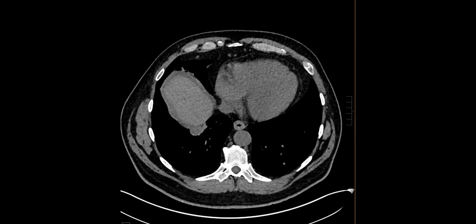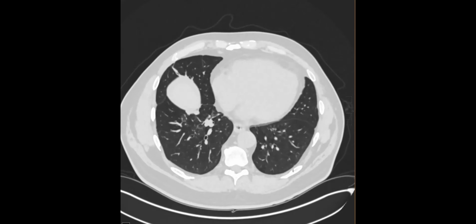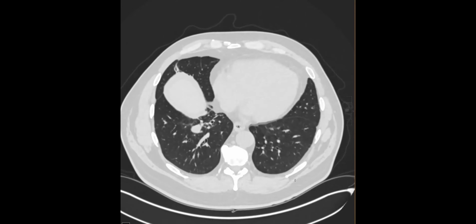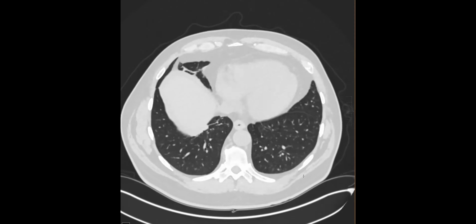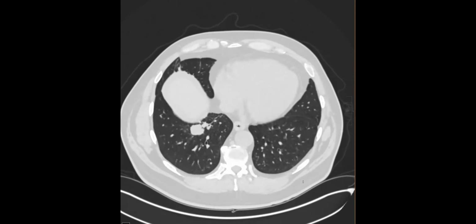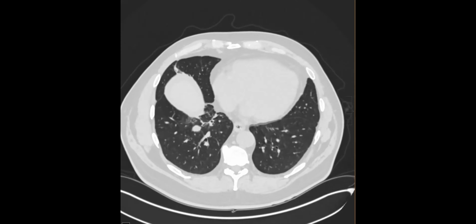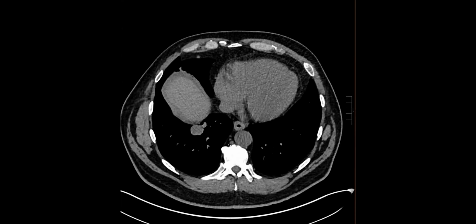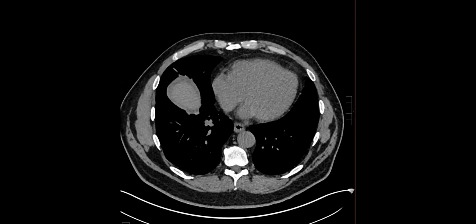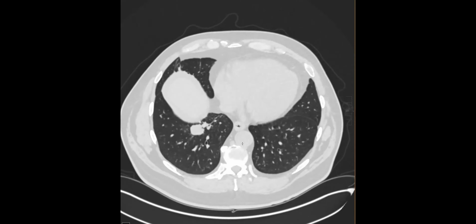So this patient had this finding on chest CT. What would you raise as your differential? Obviously, there's a worrisome lesion in the right lower, and there's probably clustered nodularity around here. So given where we are in Arizona, this region is endemic for cocci, and this was cocci. This came back as cocci.